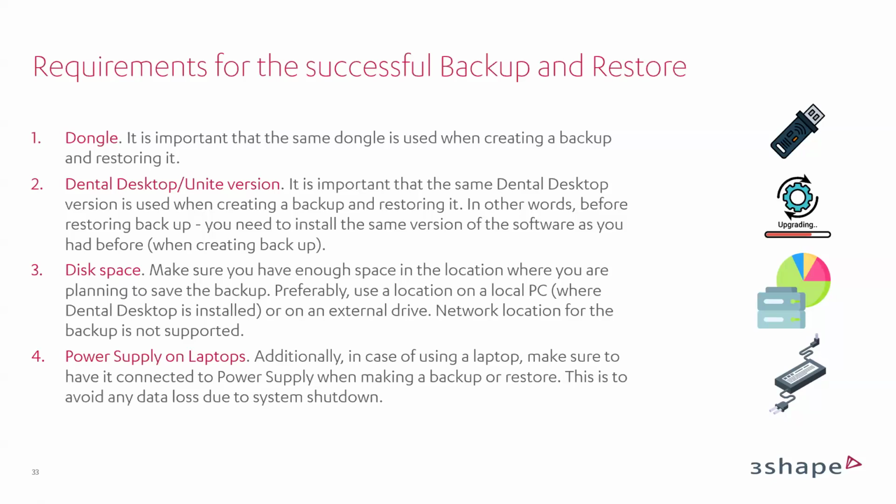Then the disk space, of course, so make sure that you have enough space to locate the backup files there. Usually, as we mentioned, we prefer a location on the local PC, but if you would like to have an external drive, or you have some other internal drive, you may use the internal drive, of course.